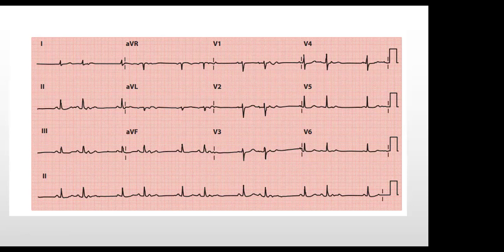And also my comment on the premature atrial contraction will be that, for premature atrial contraction, the compensatory pause is not fully compensated. So when you look at the rhythm strip here, beat 1, beat 2, beat 3, where we missed it, you can tell that the next beat coming there is well compensated, and that will speak less for premature atrial contraction.